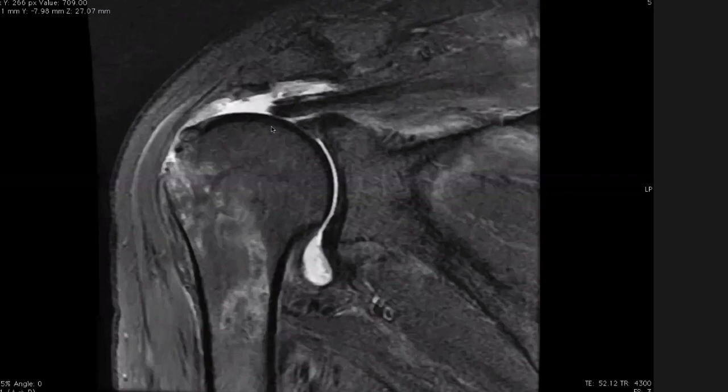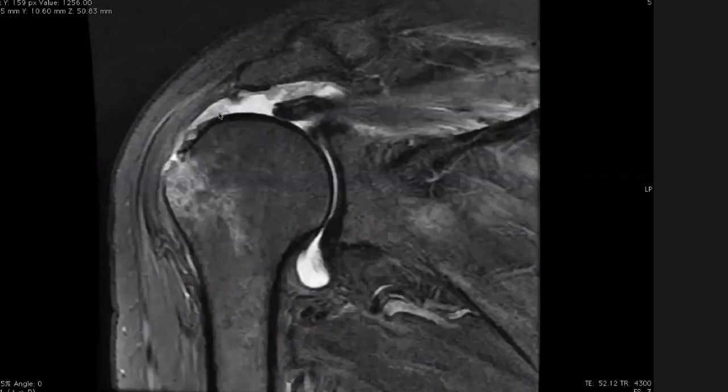If you look there, this is your glenoid, right? This is your scapular spine, and above it is your supraspinatus. Below it is your infraspinatus, right? So this is the supraspinatus muscle. That's the tendon, and you can see that instead of going all the way to attach to the tuberosity, it just stops there. So this is how a full thickness tear looks. I would say complete tear because it has retracted this much. So there is a complete tear of supraspinatus, right?